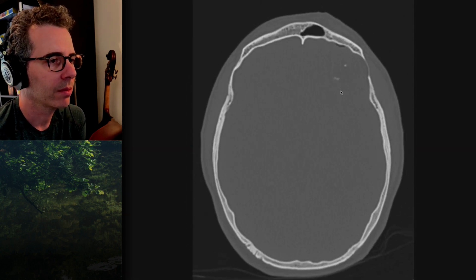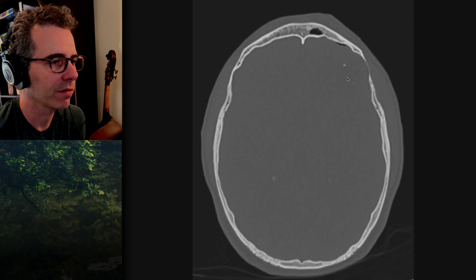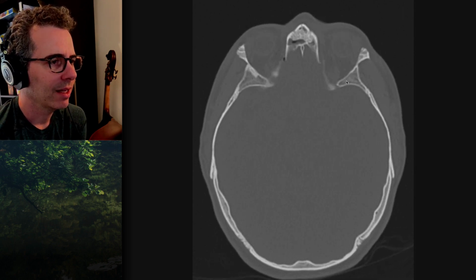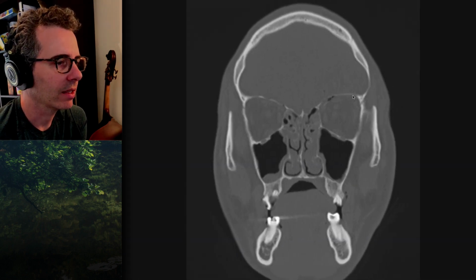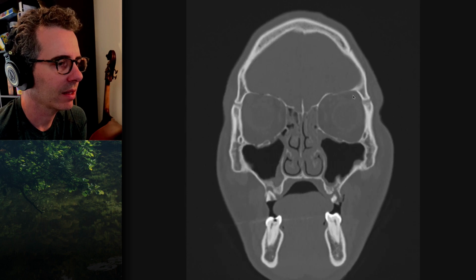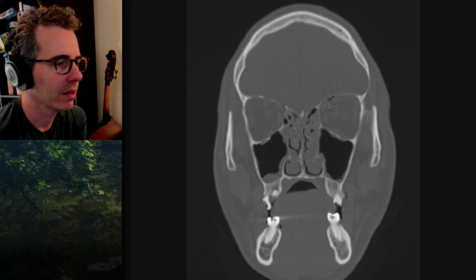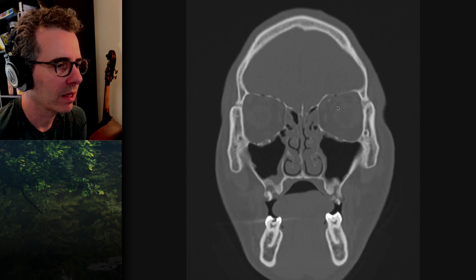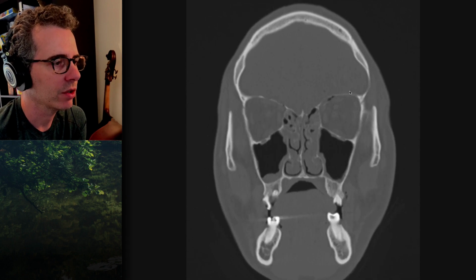That longer one is, I don't know, 1.5 centimeters long, and it's curved and goes over 4 or 5 slices. There should be a really big defect somewhere. You need a donor site, and we're not seeing that at all. There's a small fracture here, which is depressed into the orbit, and nothing's blown up into the frontal region.